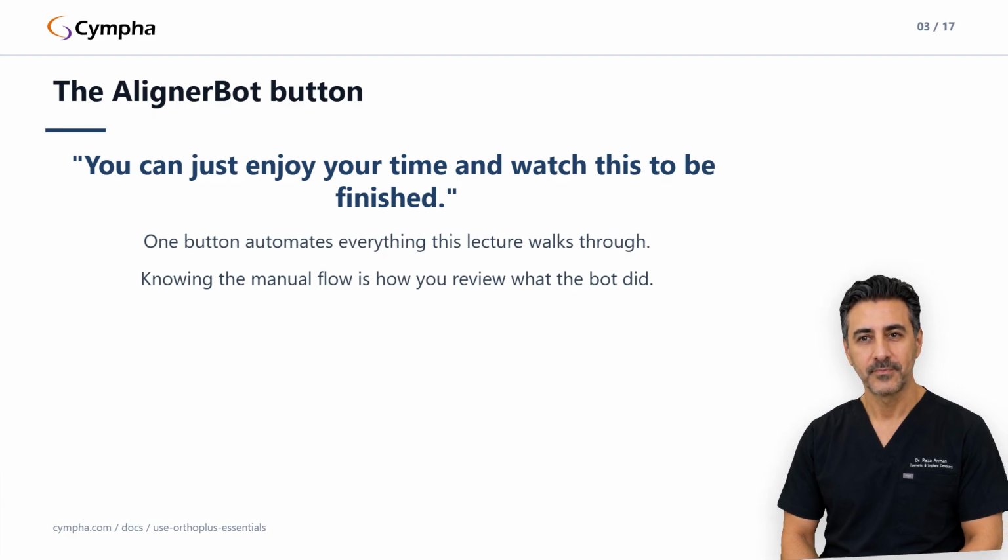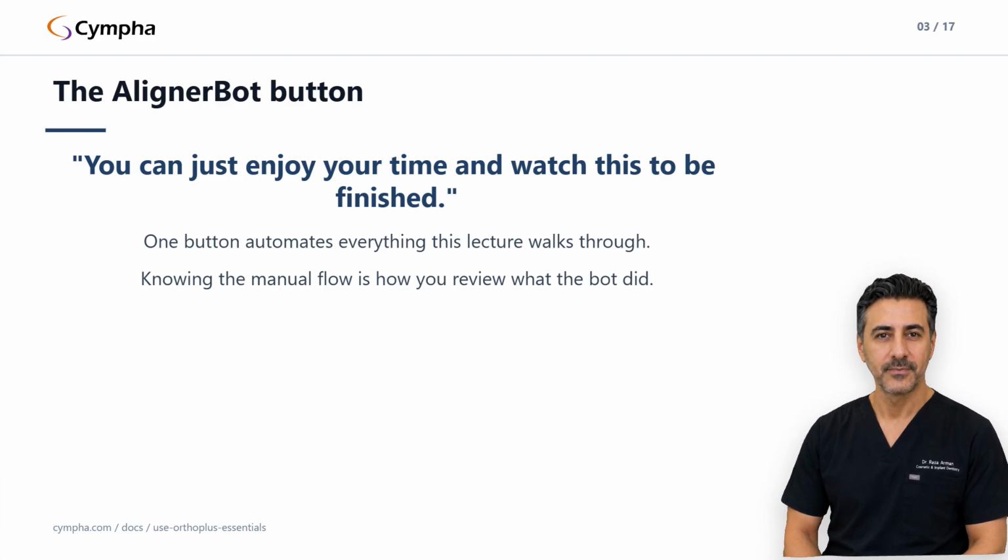So why learn the manual flow? Because the manual flow is what AlignerBot automates. When the bot hands you a finished plan, your job becomes reviewing it. And you can only review staging, attachments, and arch decisions if you know the pages where they live and what good looks like. The rest of this lecture is learning to read what the bot writes.